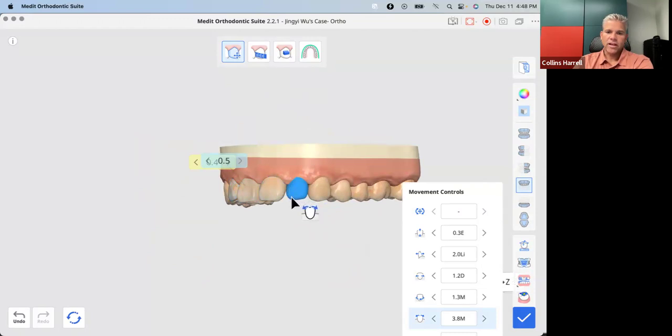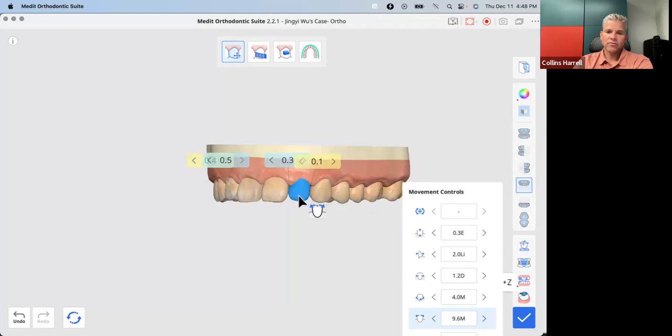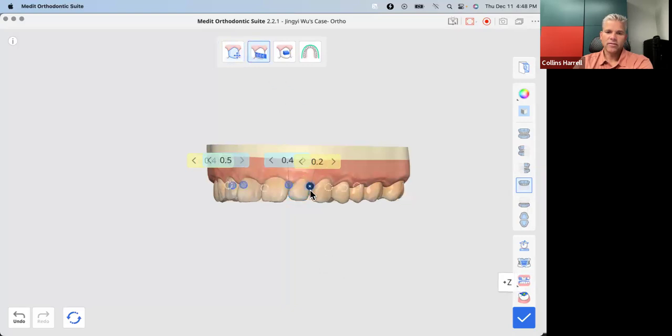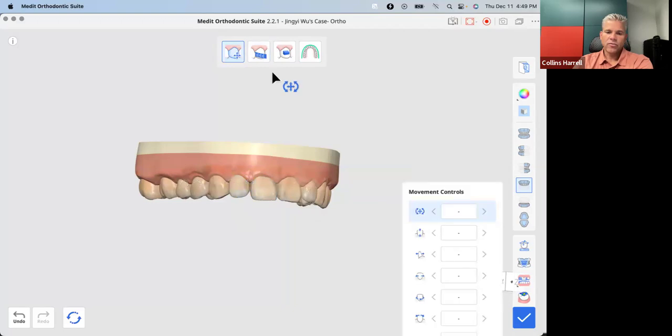So you can see that these teeth are tapered. When you go to bracket them, bracket based on that mesial line angle so that you can get some of this distal root tipping while you're in the bracket, because these teeth are going to need it in order to look good. So let's get rid of these spaces. And then back to the tooth movements.